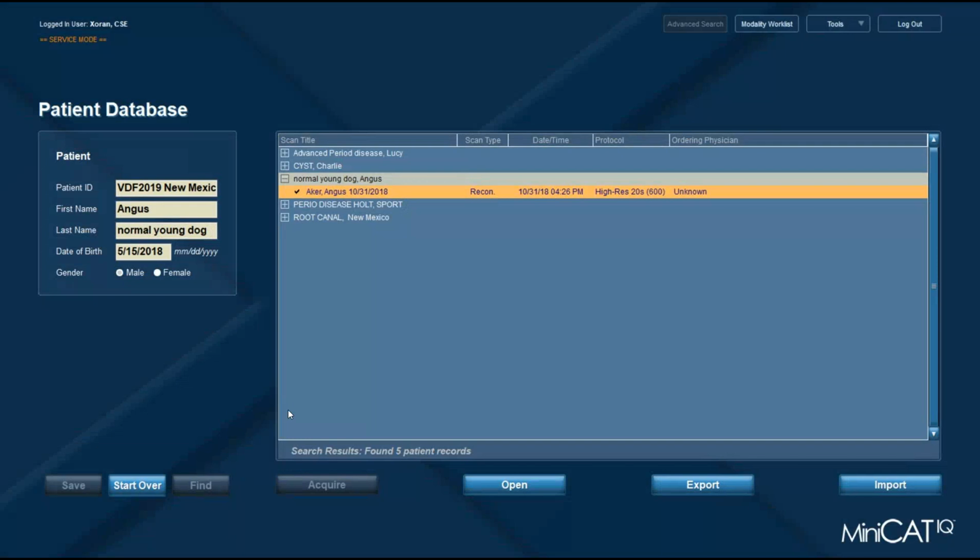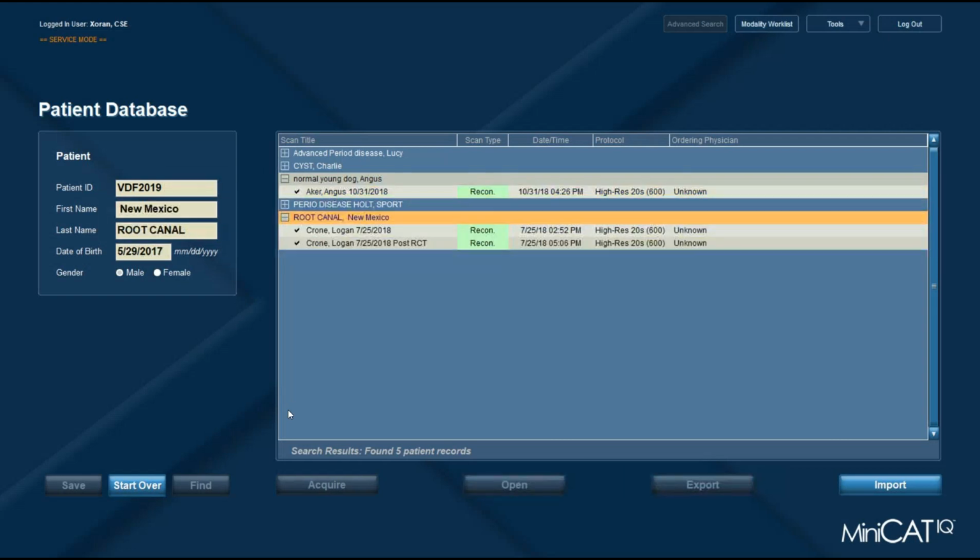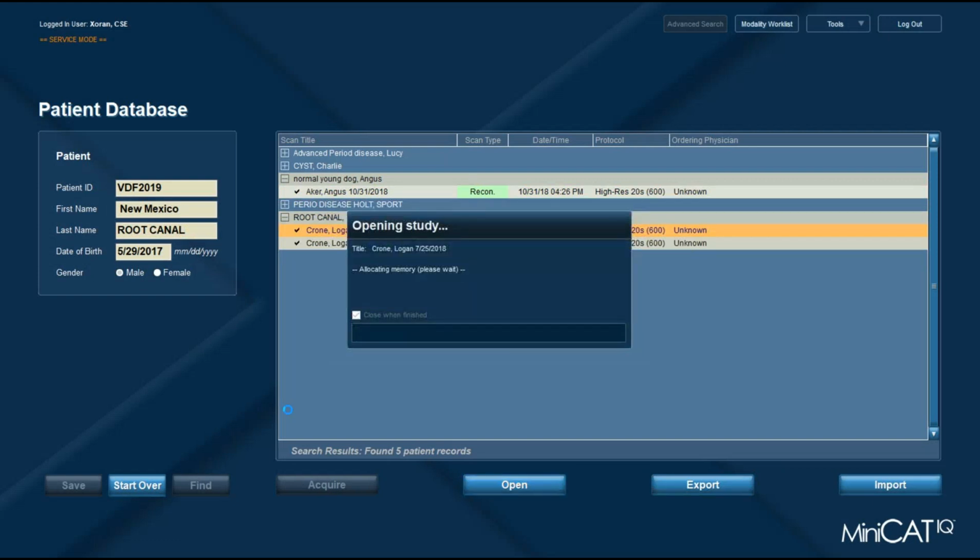What I will now do is pick up a couple examples of pathology patients. We wanted to spend a little time on endodontic lesions as well. So here's one. This is coming from Dr. Ballen's office.